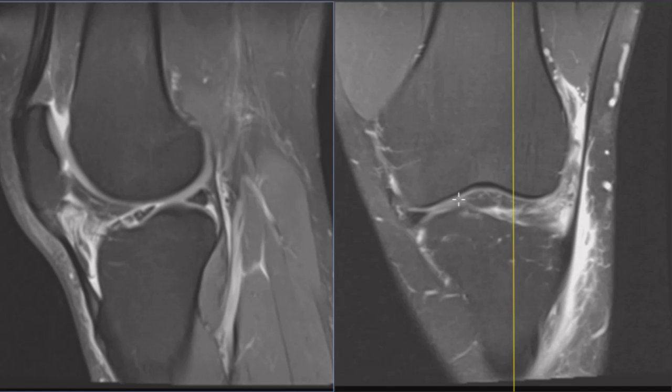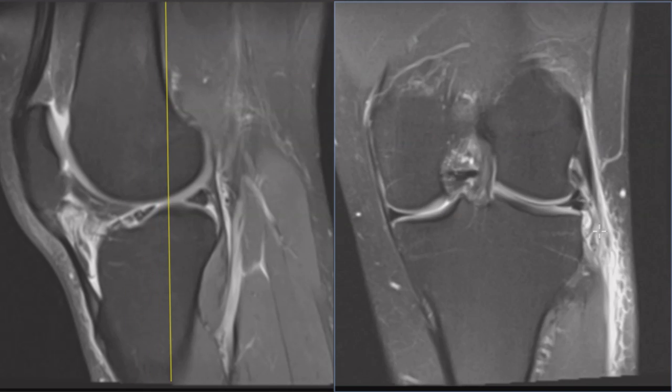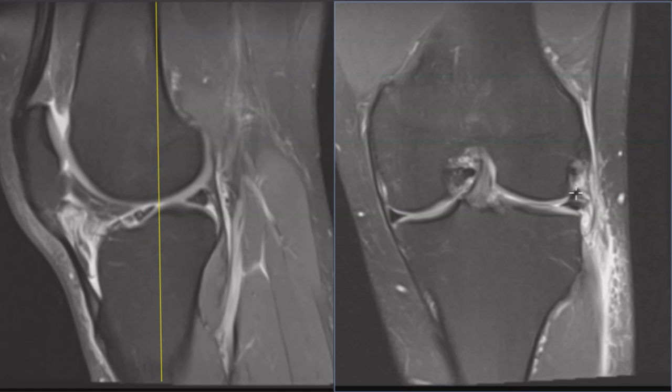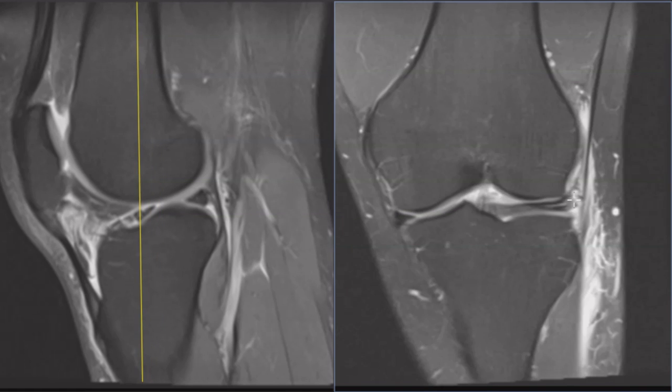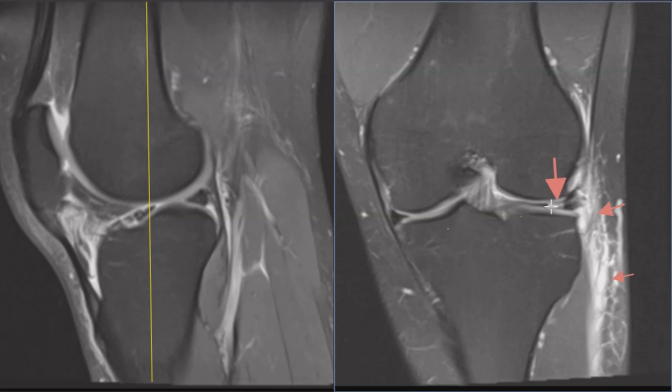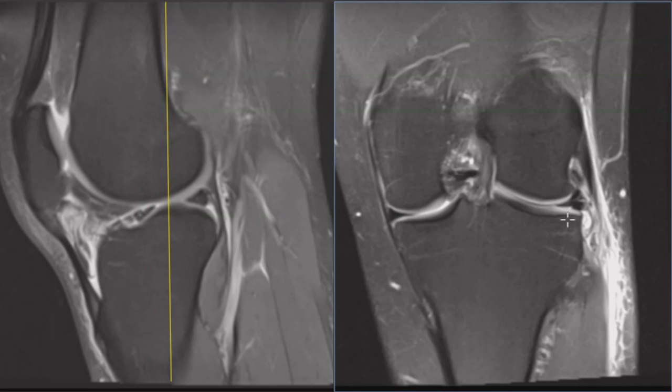Now we're going to look at the patient's menisci to see if they're okay. And we see with some big arrows here on the lateral side that there is a tear of the anterior horn and body right next to each other here. The anterior horn is here, the body is here, and right at the junction we call it the anterior body horn junction. We see a little horizontal band of fluid. That's a tear of that meniscus.